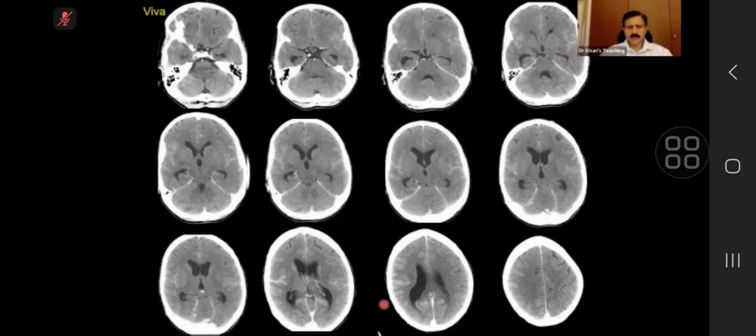Okay, I'll take over because of the time factor. This is a very, very good case, and these kinds of cases have come in the exam quite a few times. My personal students, my own SPRs, have got them in the past. Basically, what is happening here is that there is no subarachnoid hemorrhage, there is leptomeningeal enhancement, and it's bilateral symmetrical. The key thing is to look at the basilar artery, and then you understand that this is with contrast. I just put it here as a trick case, but in the exam the same thing will happen. So don't jump to conclusions.